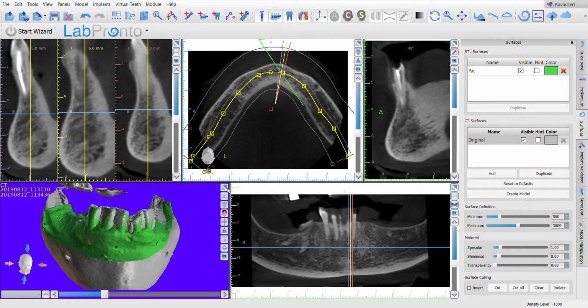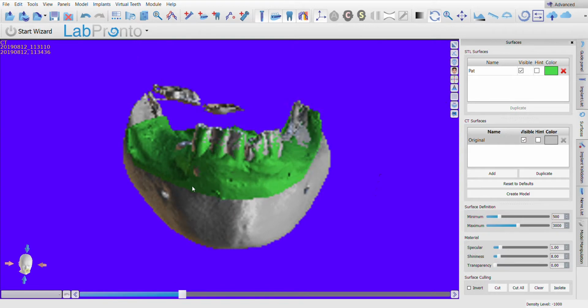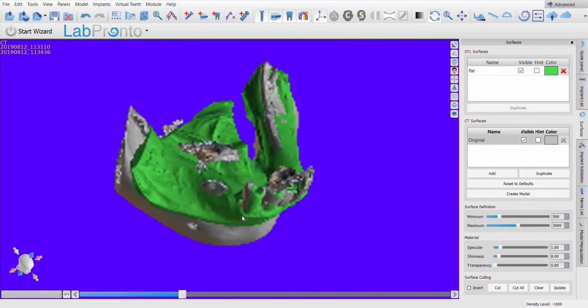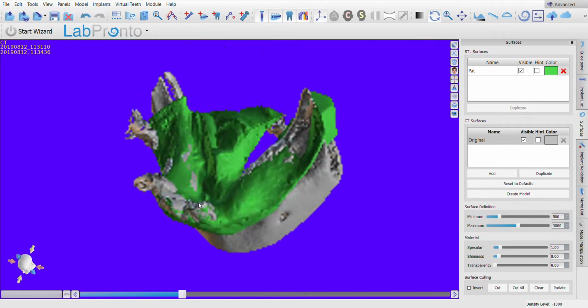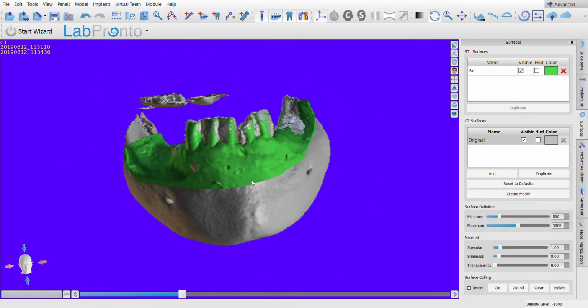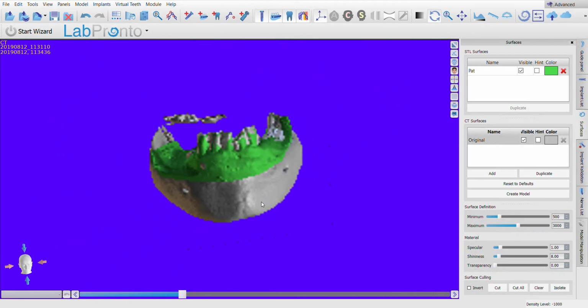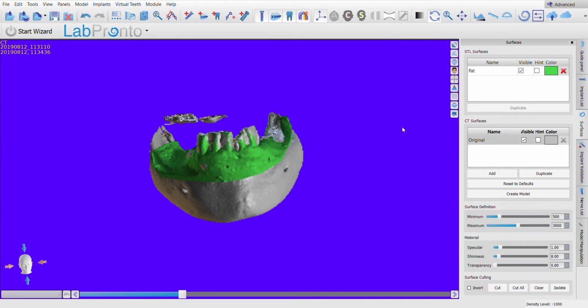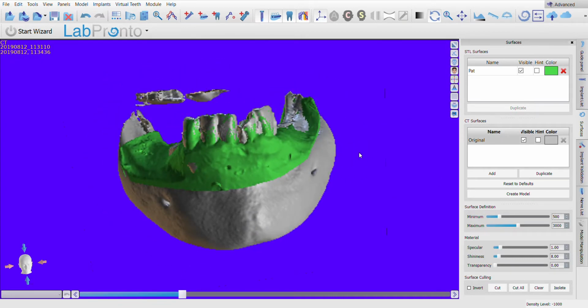And of course, this is your 3D image that you can take a look at. The way you move it is left click and rotate, up and down. You want to make it larger, right click away from you, or right click towards you, gets smaller. So that's how you could take a look.